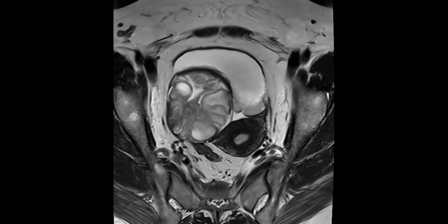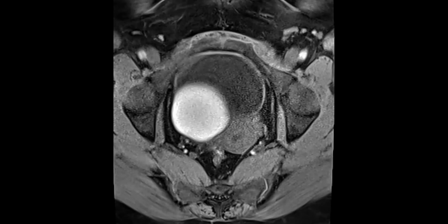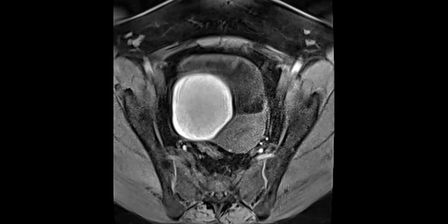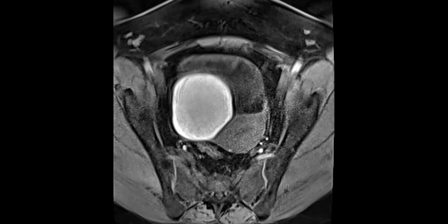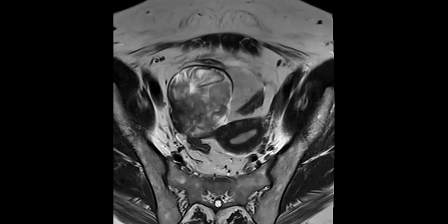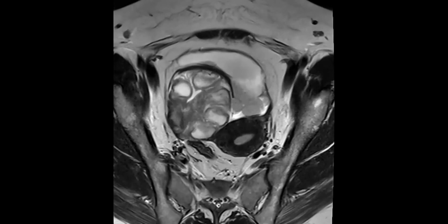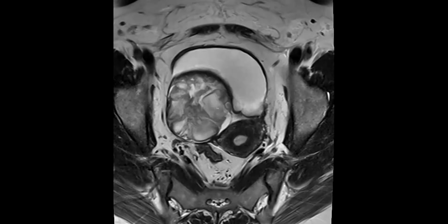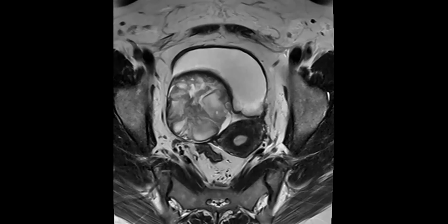Oh boy. Was there any T1 signal? I'm sorry, this is the T1 here. It's all hemorrhagic. And this was not for sure endometrioma? Correct, this was not endometrioma. And torsion to me makes sense because that's why you have what looks like these follicles, right? Right, no, makes sense. Imaging wise, in retrospect, we called it an endometrioma, but then the operative findings showed that it was the ovary. And that is insane. That is a good case.